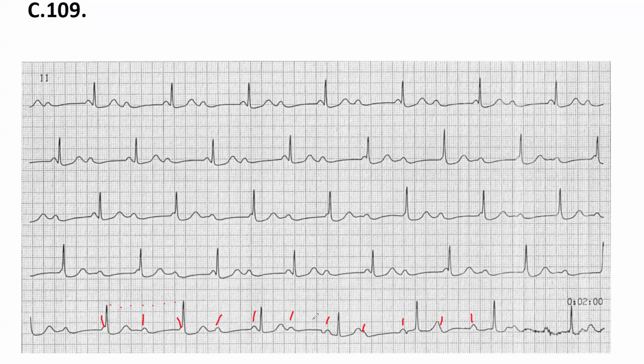If you have a supraventricular rhythm, an SA rhythm, the PR interval should be constant when P is followed by QRS. Look at this, the PR interval is very narrow, almost none. Here you see the P inside the QRS. So I would say there is no connection between the P and the QRS.